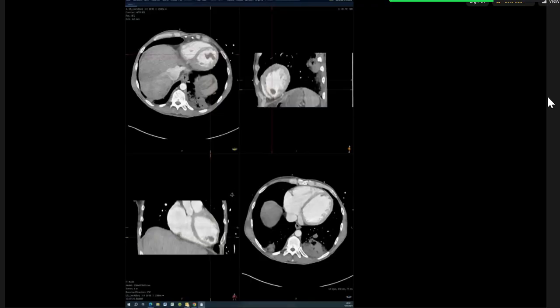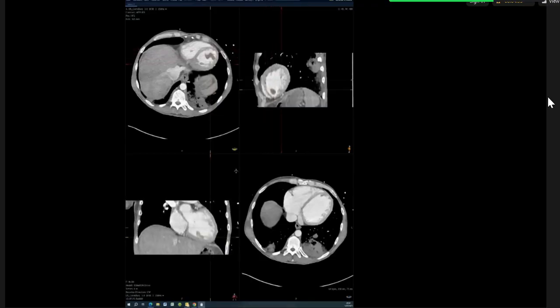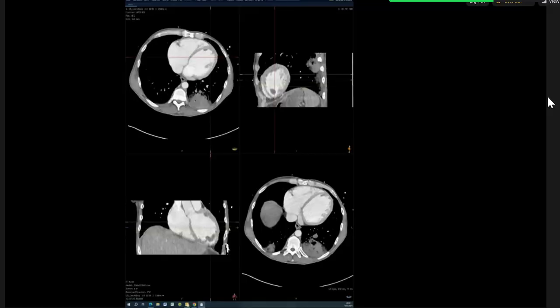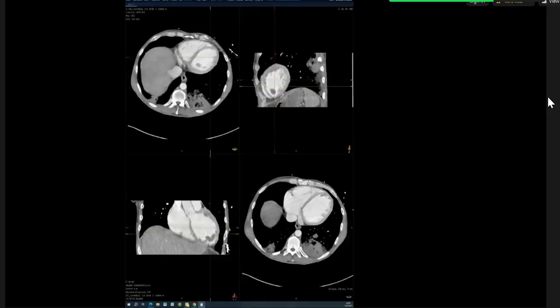So what are the infarcts then? Could the infarcts be this thrombus throwing off microemboli and causing infarcts? So what are you concerned about in the patient's history? So what is causing the thrombus?